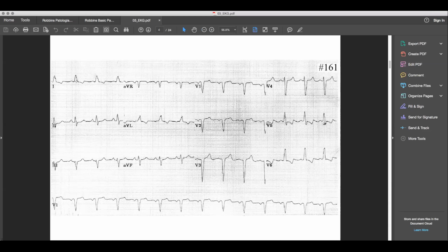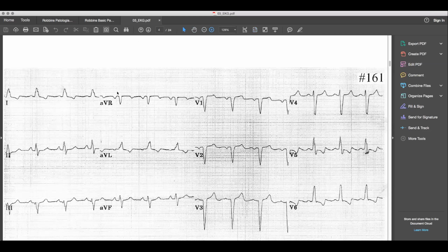Then from there, I was able to observe to start off that the QRS complex in case of lead 1, for example, in AVL, is a little longer than 0.12. It can be 0.12 or 0.16 even here, which indicates we have a wide QRS. We can also see, let me zoom a little bit, in lead 1, AVL, V5, and not very observable in V6, but right here we have a notched R.